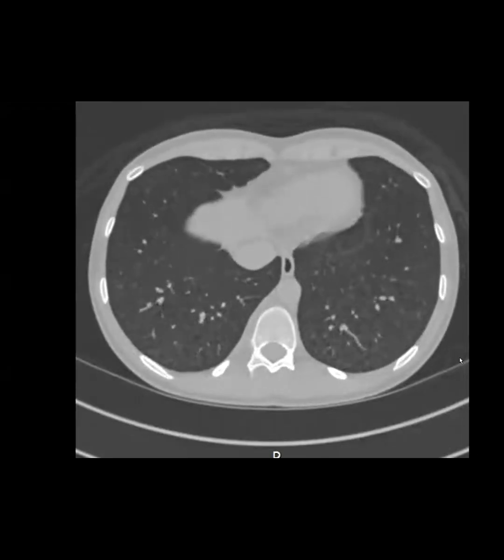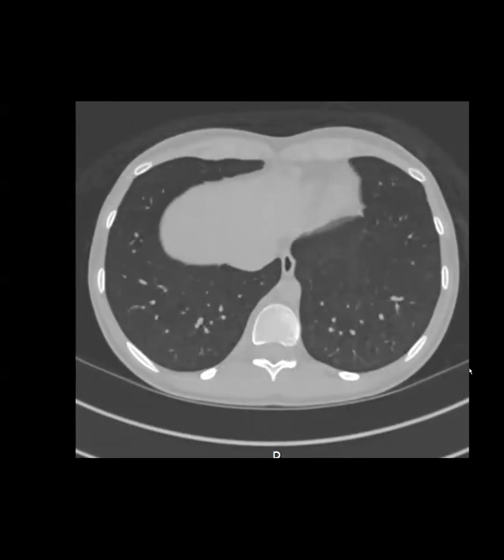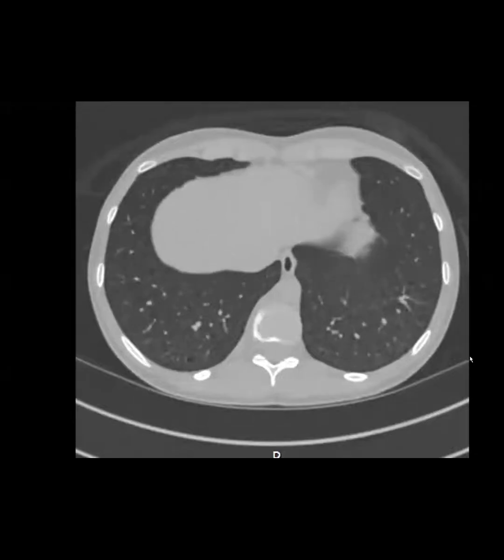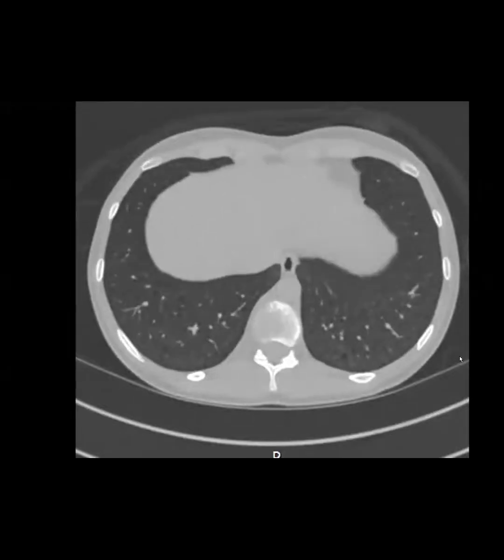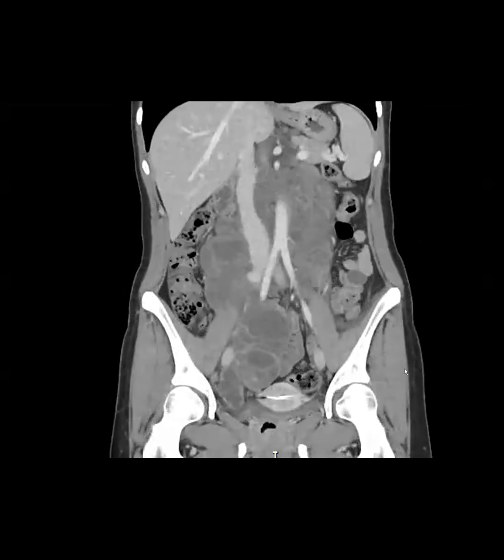It's like LAM, or Langerhans cell histiocytosis. Excellent. Yes, it's LAM, and I was very surprised that I did not know what this entity was, being trained in India. My first thought was definitely, as Dr. Shekhar's, was it TB or not? And then secondly, I was thinking in terms of germ cell tumor, but this was LAM as evidenced from the lung, and the abdominal findings were also LAM in the abdomen, and it does look really bad, like solid cystic.